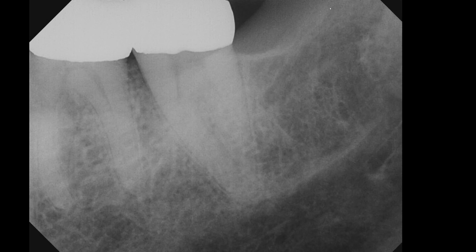Okay, so we know the external oblique ridge typically extends obliquely, something like this, close to the level of the CEJ of the second or third molar. So that's the overall direction and outline of the external oblique ridge. And if you look below, you can see that there's a relatively well-defined trabecular pattern in the upper half of the image, whereas anything below this opaque line is very radiolucent for the most part, right?